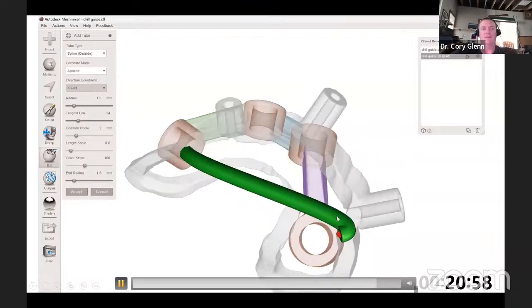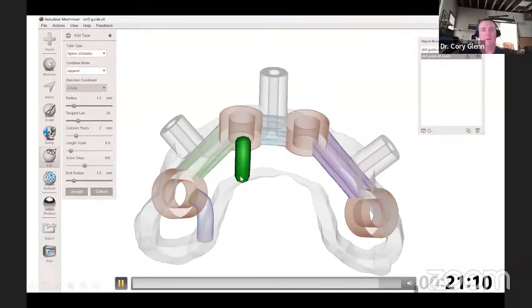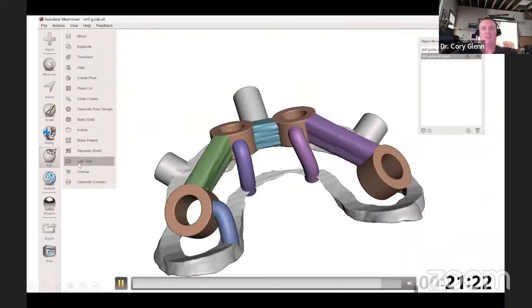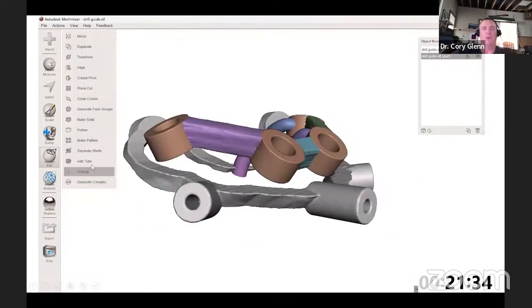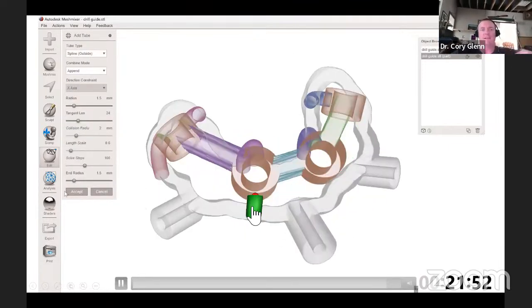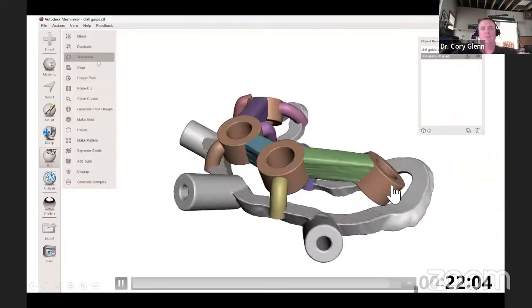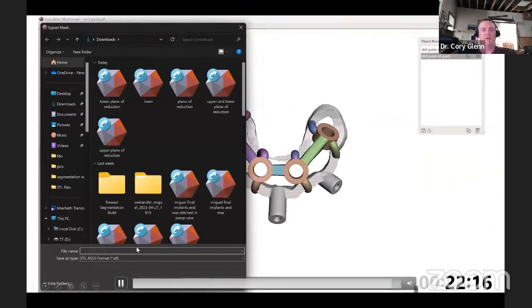So for that, I'll use this add tube feature, which is in Mesh Mixer. And you can see when you punch that add tube button, it just gives you a red dot on each end. We can position each end where we want it to be. I can control the radius of the thickness of these tubes, but I'll basically just do a buccal and a lingual connection from each tube down to the guide. And this is the final result.